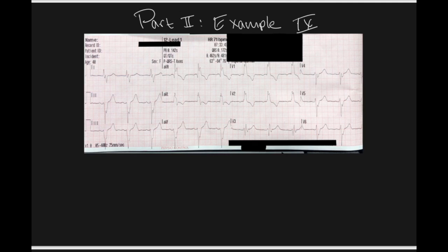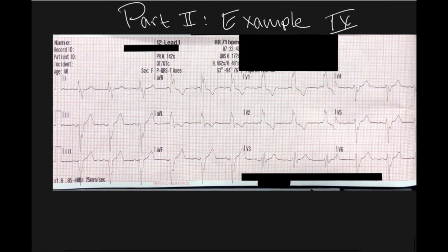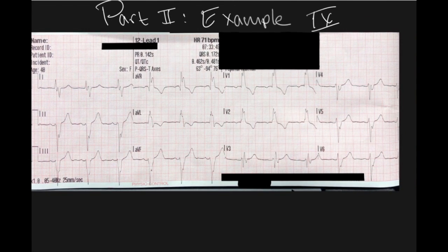All right, do your thing, so pause it and come back when you're all done. All right, welcome back. So let's see, what do we have here? We see that our first pattern is disrupted because we have some profound negativities in the left. We see aVR is not negative. We see that the V1 to V6 pattern is almost reversed. We see that we have some T wave inversions. And what else? Do we see anything with the Q waves?